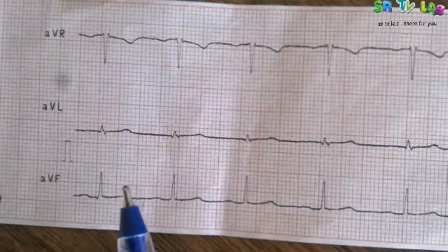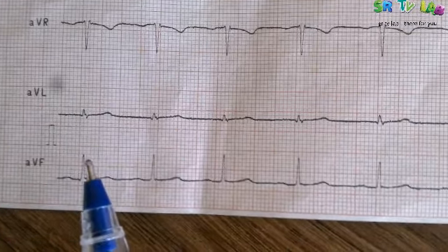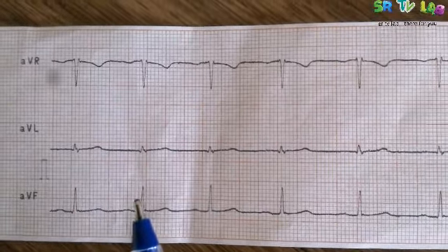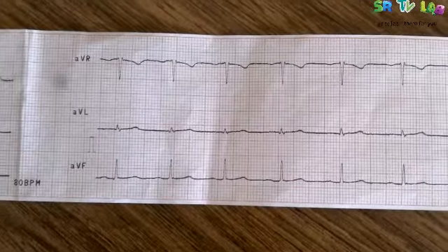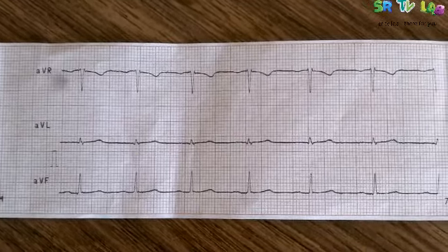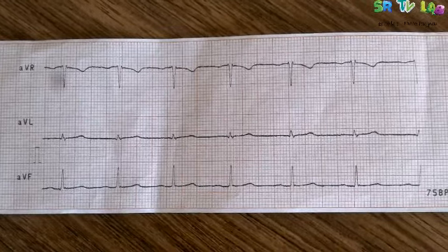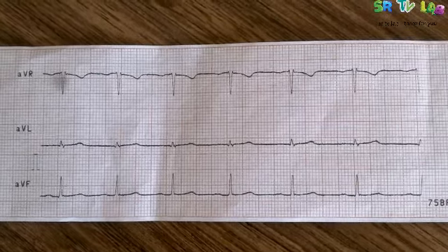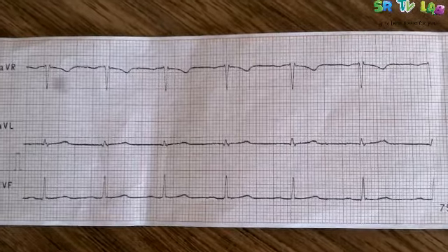Good. And you remember, when this electrocardiogram lowers within the electrocardiograph, 5 big squares lowers within 1 second. You get me? 5 big squares lowers within just 1 second, which means within 1 minute, that equals to 60 seconds. We will take 5 big squares times 60, which is 300.